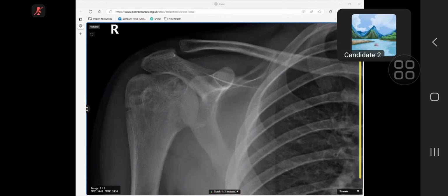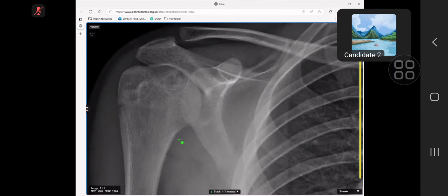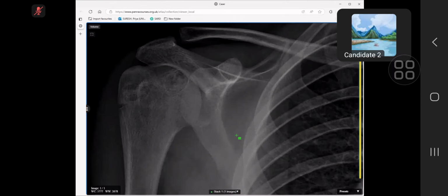There is some fuzzy outline along the medial cortical margin, and also the density of the cortex and the density of the medullary cavity were different, yes. As it is a pediatric age group patient, and I also appreciate some prominent notch along the inferior scapular margin, but that can be due to a spur.